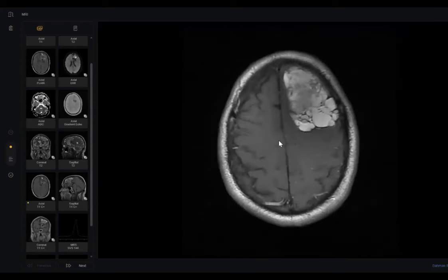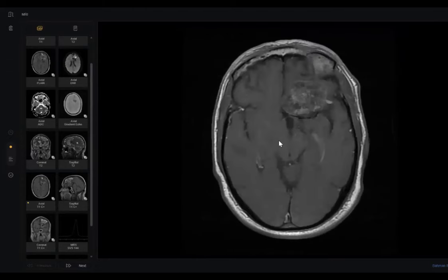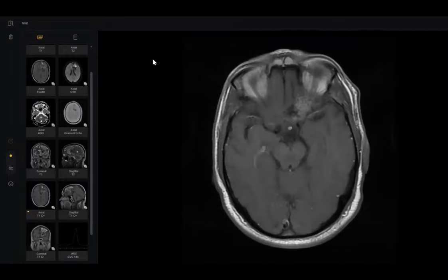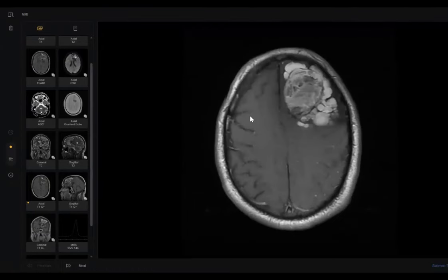After seeing the T1 weighted image, there is no significant post-contrast enhancement seen within this lesion. Can I see side-by-side T1 pre and post-contrast images? No, this is the last chance, the last sequence, and you must give me an answer. What do you think about it?